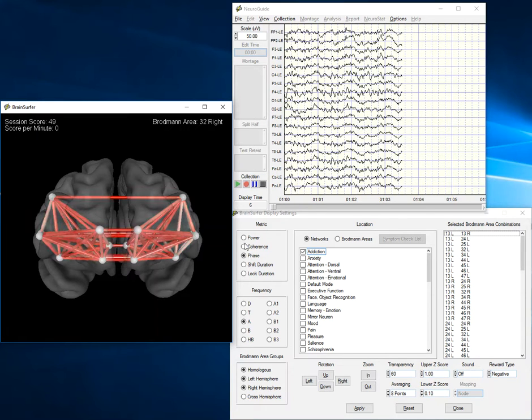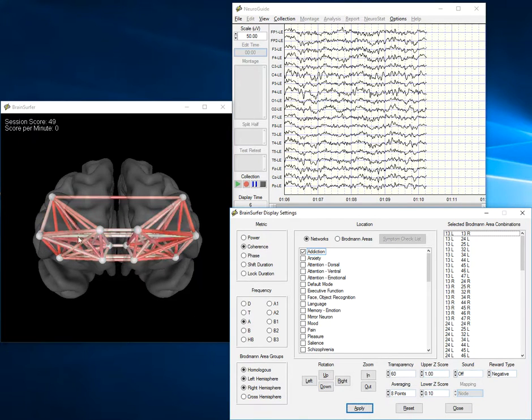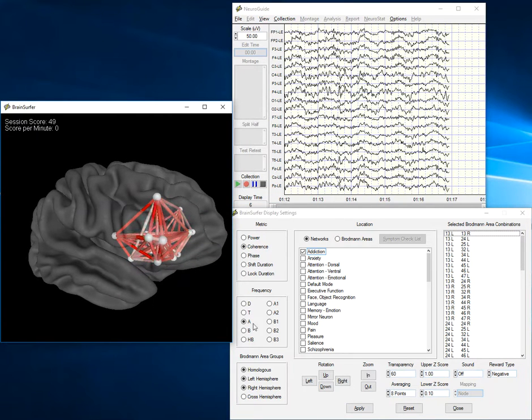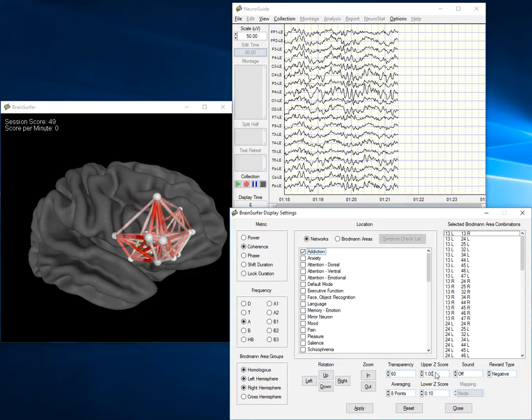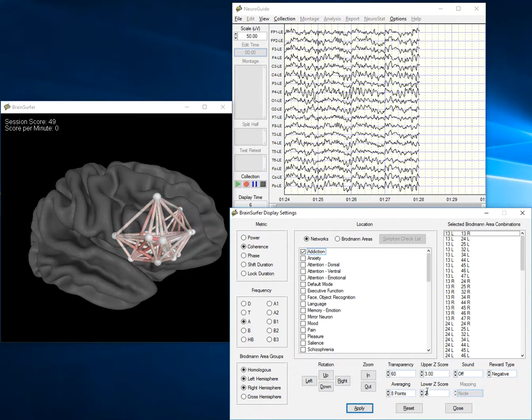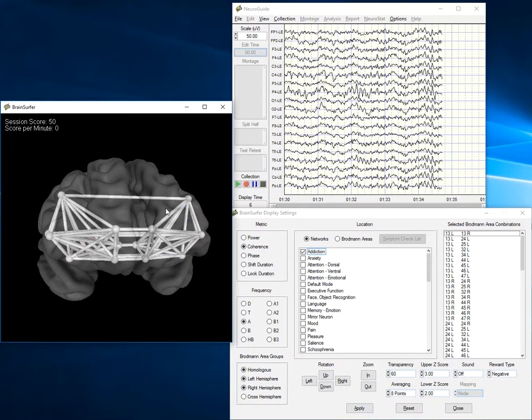I'm going to now look at coherence, which is the functional connectivity between the nodes. And the nodes are red because I've set the threshold for this individual, who does not have drug addiction problems and substance abuse problems, so that the threshold is very, very low. Normally, we would have the upper threshold at 3 and the lower threshold, let's say, at 2 standard deviations, in which case you have a fairly well-behaved addiction network, because this is now a normal network.